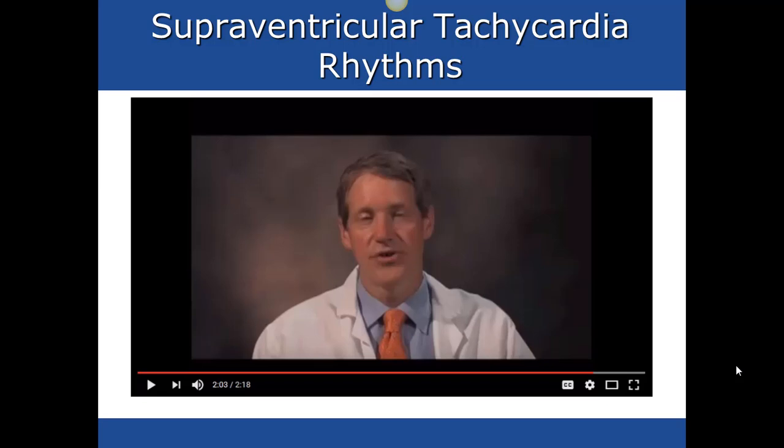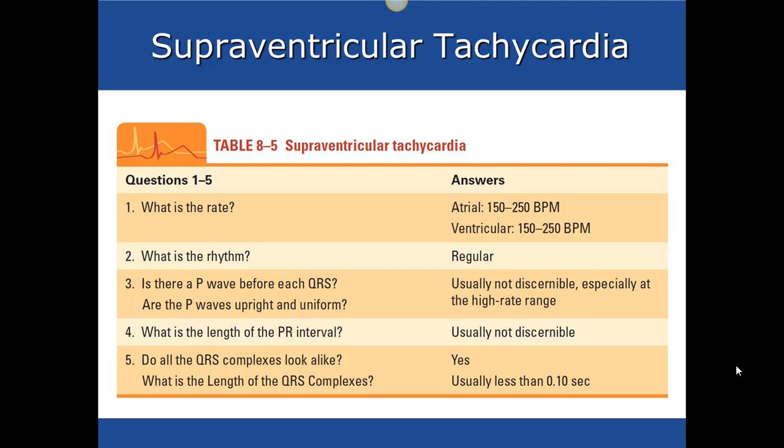It can resemble a rapid sinus tachycardia. Sinus tachycardia seldom exceeds 160 to 170 beats per minute in the high range, although sometimes it can. So as we're going through, we look and see what the rate is. The atrial rate and the ventricular rate typically are going to be the same, so it'll be fast, generally very fast, 150 to 250 beats per minute. The rhythm is almost always regular, primarily because you still have the same pacemaking site functioning.